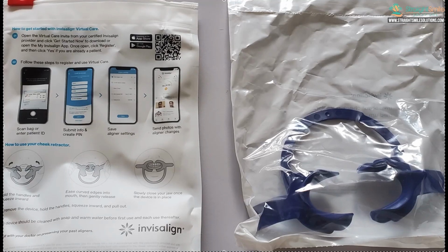But this is $10 per patient for this basic retractor, which you don't have to use. The one thing that's nice about this retractor is that it has these curved handles, so it's easy for them to retract the buccal segments. So you can get a nice picture of the bite in the back and stuff like that. That's the nice part about it. But honestly, you can buy retractors in bulk from eBay or Amazon for pennies per retractor. And you could, in theory, do that.